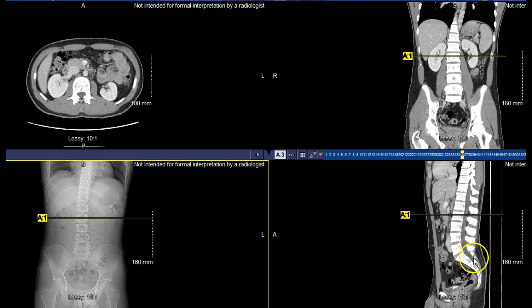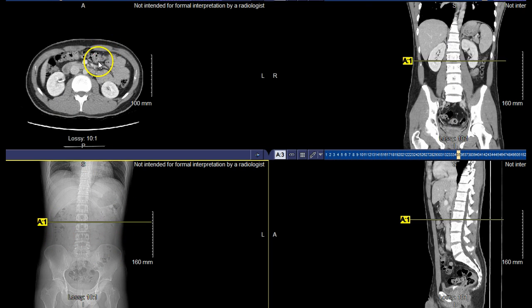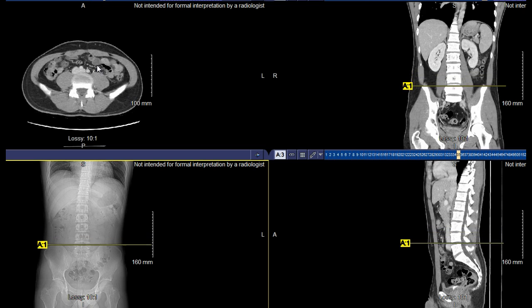But you can see just purely based on body habitus of this patient, this patient's pretty small. So the bowels are wedged in there. So it's not as clean as a hypersthenic patient where you're seeing those true separations of those bowels, and you really can see that classic appearance of where the transverse colon is versus where the ascending colon is respectively. You kind of look at the patient just on the scout image, and you can look at the loops of bowel, and you can see how loopy it is for this patient, which is very classic for an asthenic patient, and that's what we're really seeing here. So not classic by any means, and bowels are pretty difficult to look at in general.